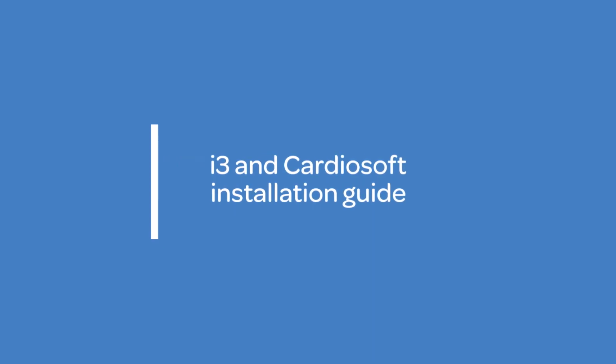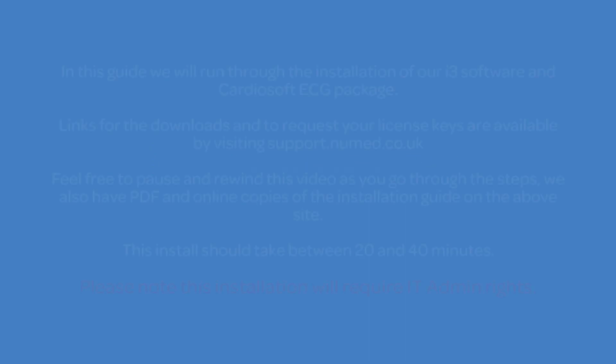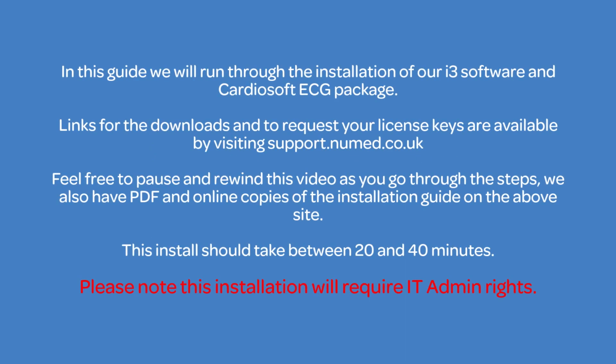Welcome to the i3 and Cardiosoft installation guide. In this guide, we will run through the installation of our i3 software and Cardiosoft ECG package.